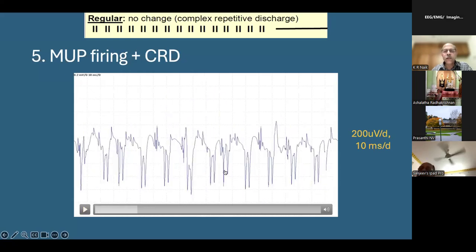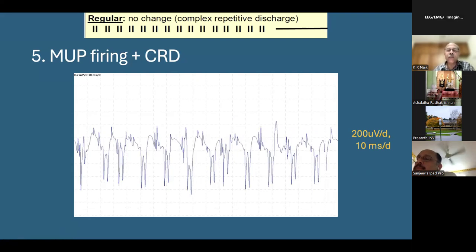Now, how much is the interval from one to the second one? This is 1, 2, 3, 4 length. From one burst spike, you have about 20 milliseconds. So 20 milliseconds is from one spike or one set of spikes to the second spike, then to the third one, then fourth, like that. This is due to overlap here. Around 20 milliseconds is the inter-spike interval, interburst interval.